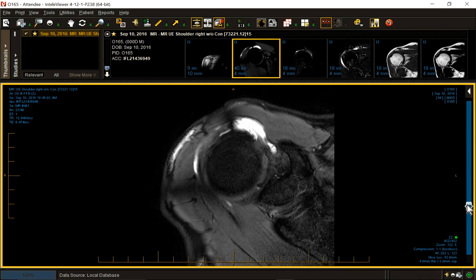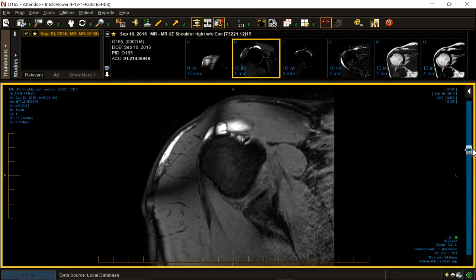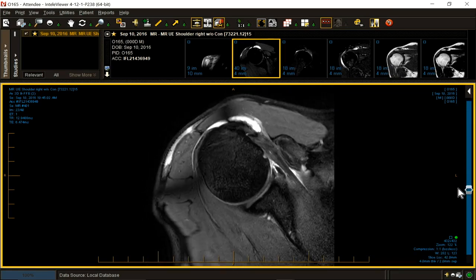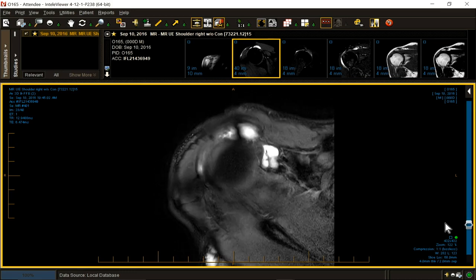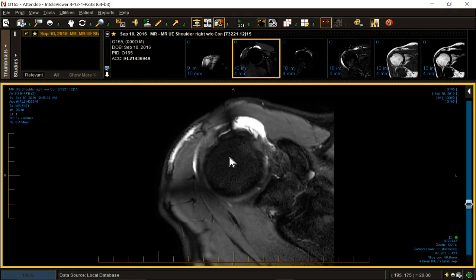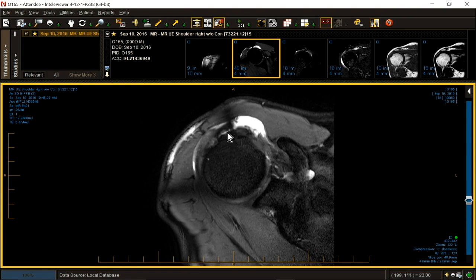We have quite a few hot spots. And that's really a nice way for you novices to look at a case like this. Just look at it like a bone scan. Where are the bright areas? That's easy. Then you try and figure out what the bright areas mean. So the bright areas are anterolateral, and at least one of them appears to dissect into cuff tissue.